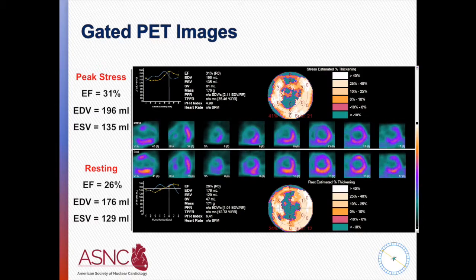Again, the fact that there's severe regional dysfunction in the LAD territory, both at rest and at peak stress, does not completely answer the question of myocardial viability, as this severe dysfunction could represent severe resting ischemia or permanently infarcted myocardial tissue.